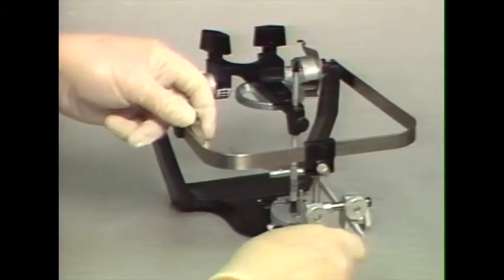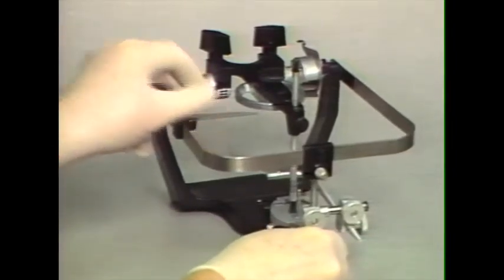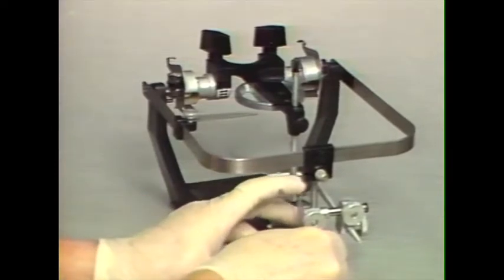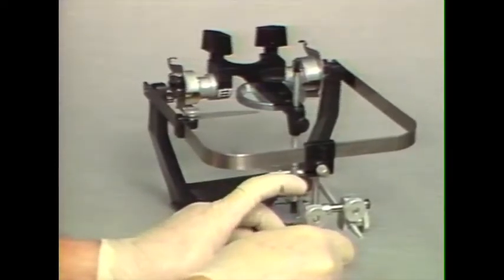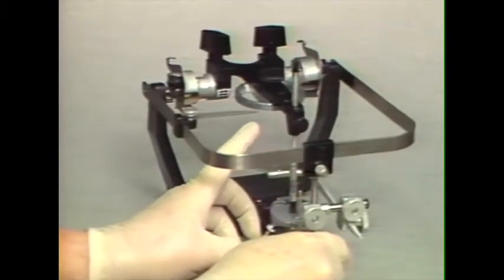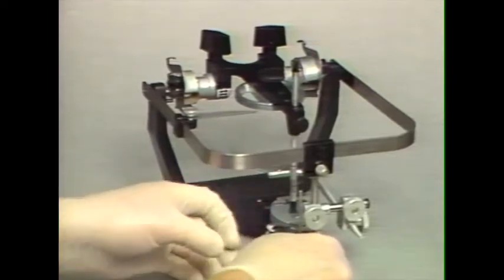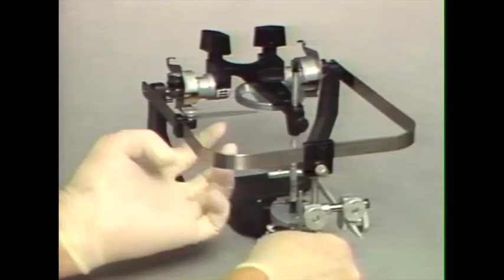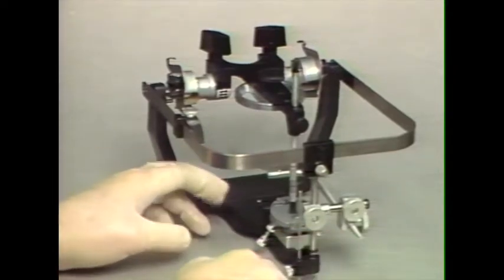We then can use this anterior elevating rod to set the proper vertical level of the facebow record, and that is either to the axis orbital indicator if one is on the articulator here, or to the lower level of the maxillary mounting ring. We then would be ready to use plaster to attach the maxillary cast after we place cast support in the lower members so that the facebow does not sag.